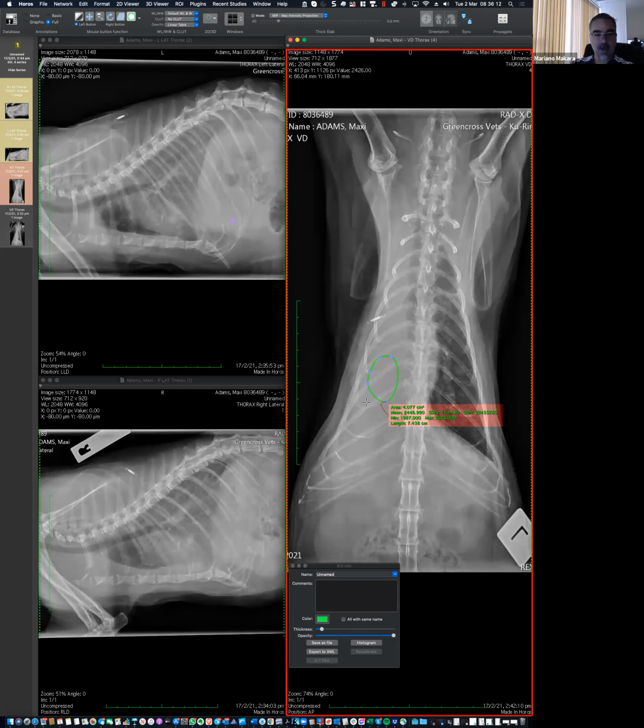So you don't see the mass, but if you put something in that airway up in the bifurcation, as it goes into the main right lung lobes, the principal bronchi, then you can explain everything that is happening. There is one more mechanism by which something like a mass up there could result in disappearance. So it's not the bleeding, but it's the obstruction of the airway.